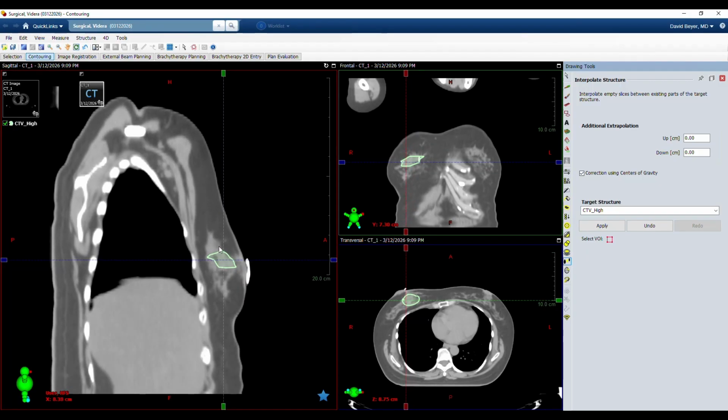And again, where I draw that line is absolutely arbitrary, and I hate doing that as a radiation oncologist where I don't know precisely where my target volume ought to be. So that's my frustration with breast cancer contouring as it currently stands using fiducial markers.